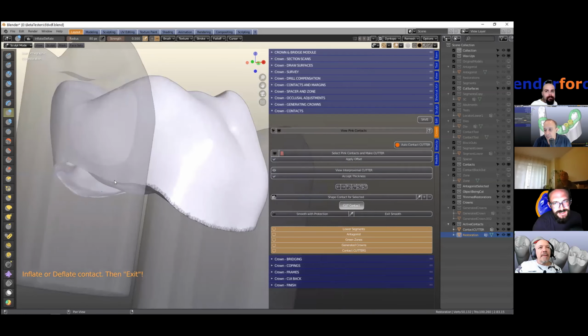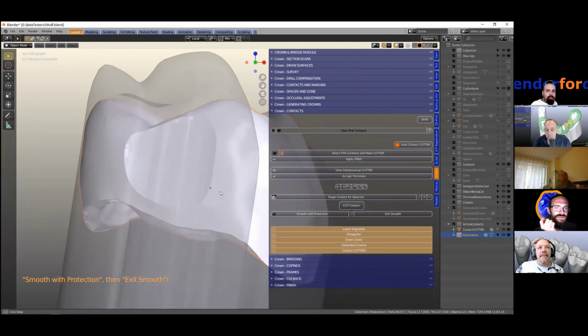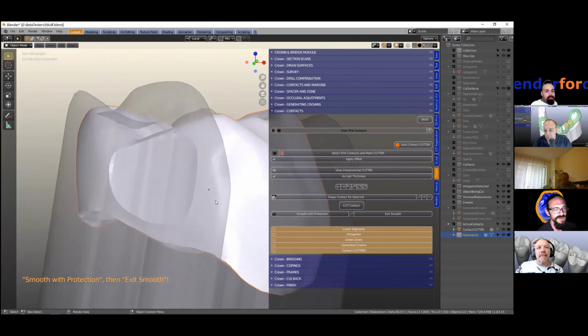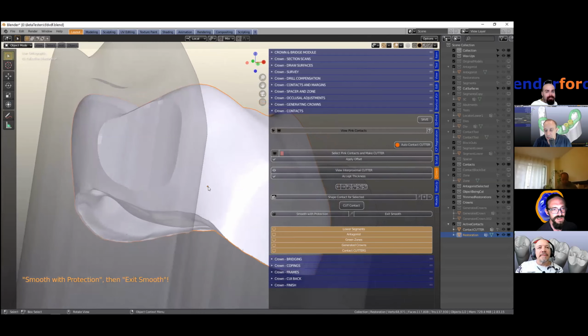You can always add something; the dentist could add composite if the contact is like a wall like this, and he hopes that you have a contact point. That's not okay. But you also have to think about micro brushing, brushing into the interdental space. And I like the idea that the dentist can make some space in order for the hygiene to be okay. So I really like this functionality of shaping the contact area. Very nice. Yeah, that's good.